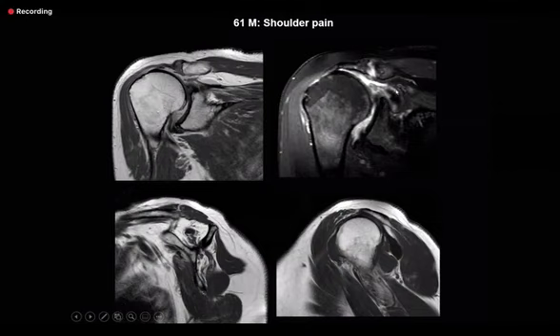Now, what is happening is that this is the supraspinatus component of the rotator cuff. It goes from here and should have been attached here. There is nothing here. So in your pertinent negatives and positives in your description, please remember they will give you some marks for that. Even once you get the diagnosis, you are passed, but your endeavor is to get more and more marks. So there is a massive full thickness tear with retraction of the musculotendinous junction. It is retracted here. It is sitting here actually. It should have been here at the 12 o'clock position.